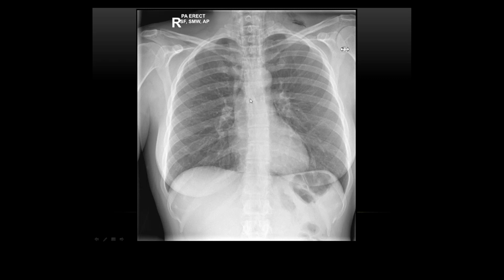Is it coming from there? Now, look at your mediastinum. So first off, look at your heart. It's the first area I always look at. Nice heart border, a bit of air, and then what's this? You've got another very thin line there, and that line you can actually follow all the way up. Can you all see that? And you've got a bit on this side as well. So what you've got is trachea, then a bit of soft tissue, then air, then another line of soft tissue, then air. That's not normal. So this patient's actually got pneumomediastinum. These can be extremely subtle.